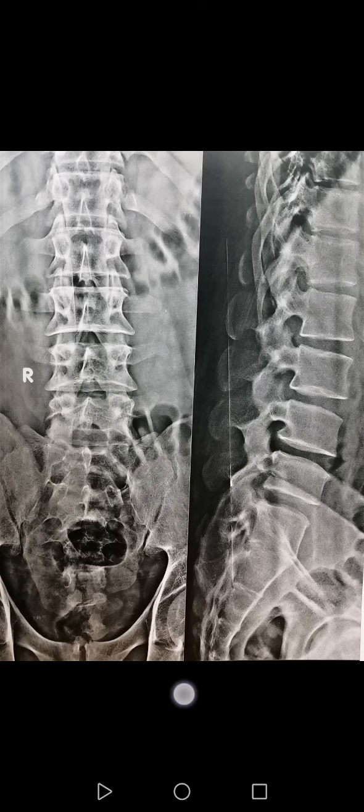Yes, we are again here. This X-ray, if you want to comment, scientific comment, you will say what type of imaging for the start. This is X-ray, so it is not CT, it is not MRI, it is not PET, and so on. It is an X-ray. On what region? Yes, lumbosacral spine. So this is X-ray lumbosacral.